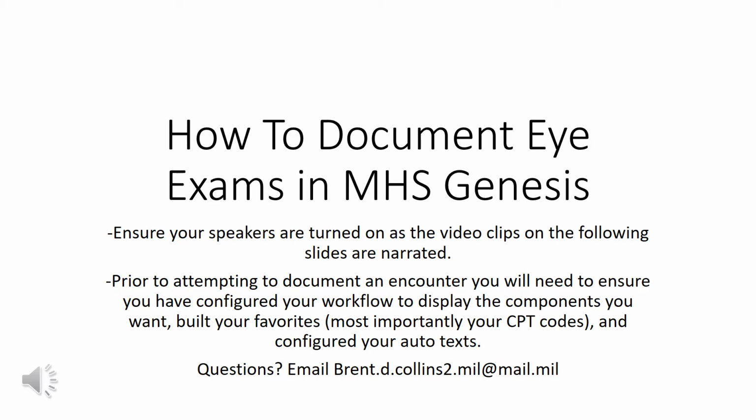This presentation will demonstrate how to document eye exams in MHS Genesis. Quick disclaimer, this product is not sanctioned by Cerner or MHS Genesis.